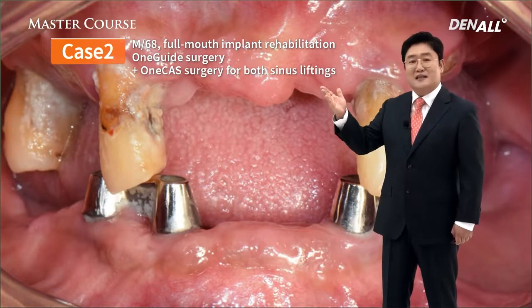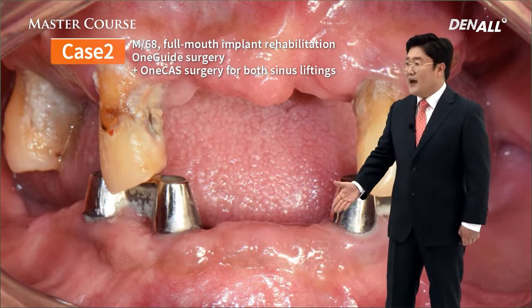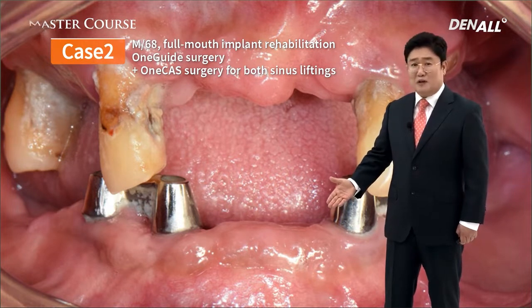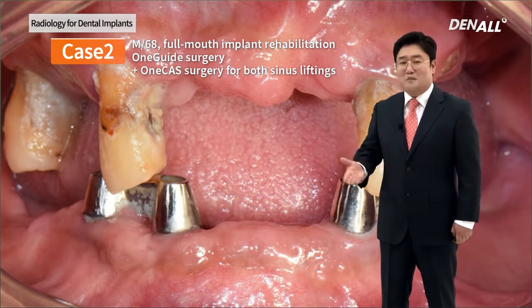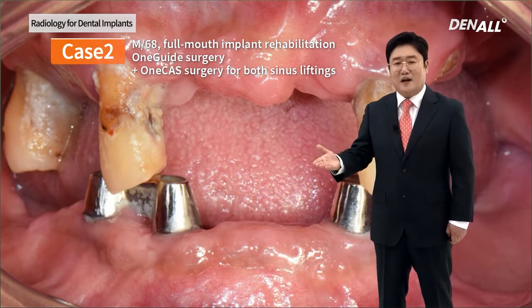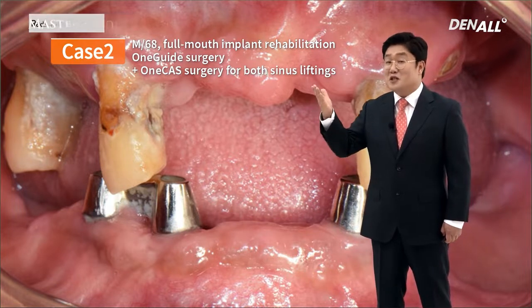A clinical case, a rather old male patient, RPD. The partial dentures are worn by the patient on both jaws, and the patient doesn't want to wear them anymore.